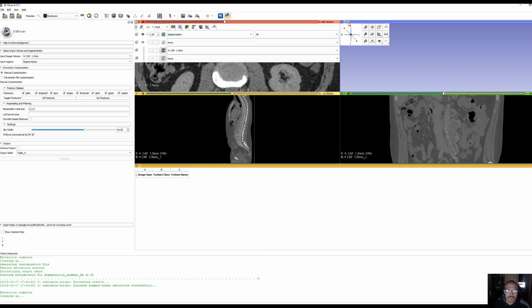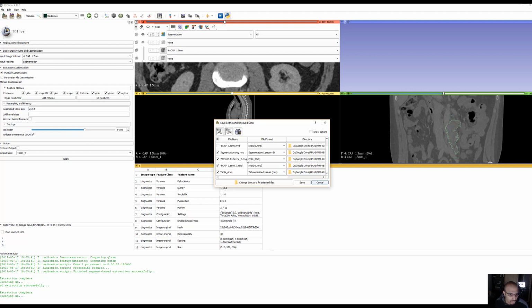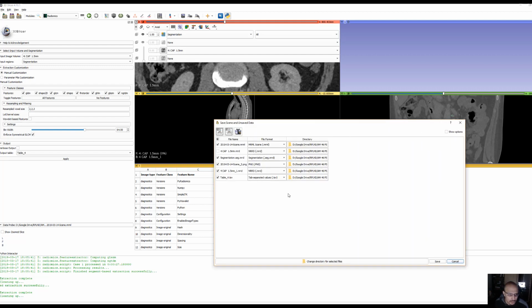Right, and so you got it. Now what you want to do is again save it, and remember the guy's ID, AM46.